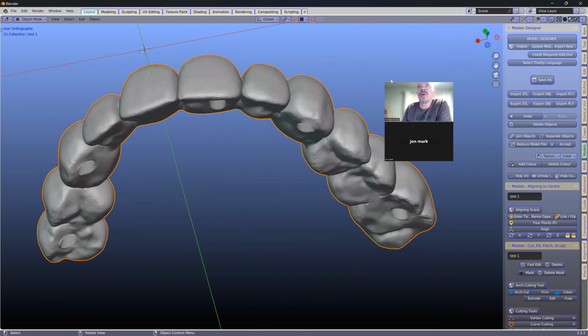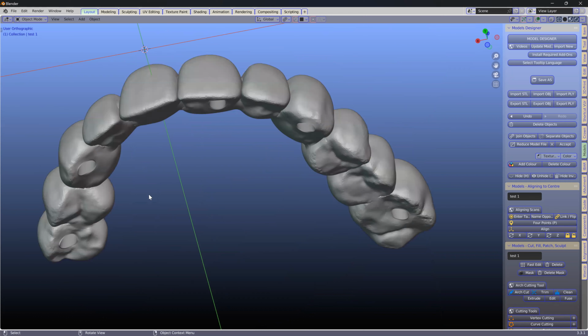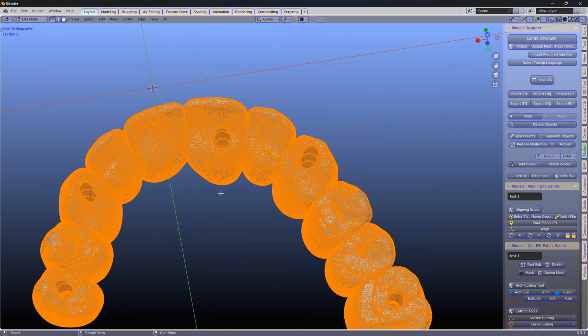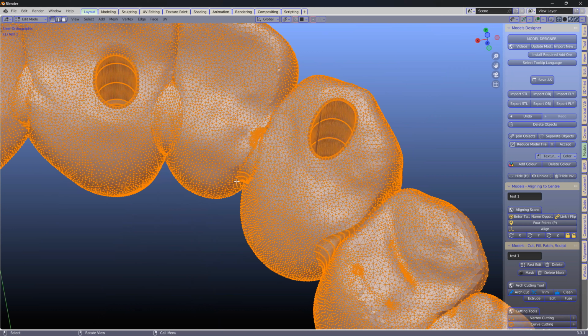All right, so yeah, the mesh structure looks all right. It's a good idea for you maybe to watch a bit of the model design videos, because that'll give you an understanding of the mesh structure. We can work in edit mode in Blender, so we get to see all the vertices and all of that stuff. So have a look and see how that goes.